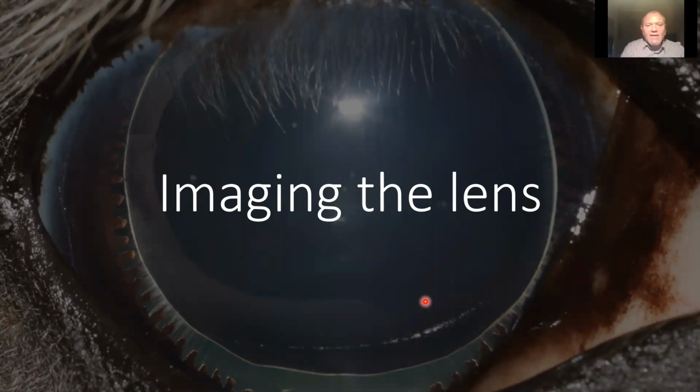That brings us on nicely to imaging the lens. One of my favourite photographs here. This wasn't taken with an iPhone, actually. This was on my digital SLR. This is a horse born without an iris, aniridia. You can see the edge of the iris here, the ciliary processes, and the zonules linking here, holding the equatorial lens.